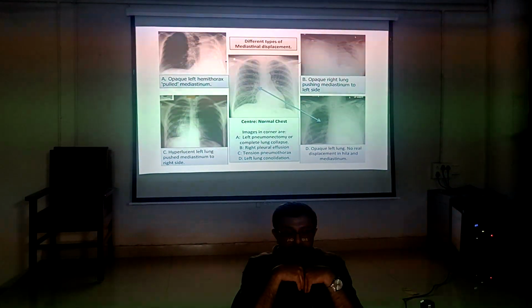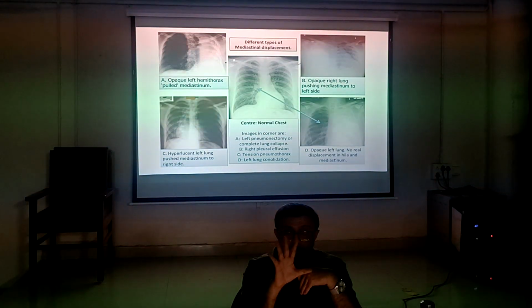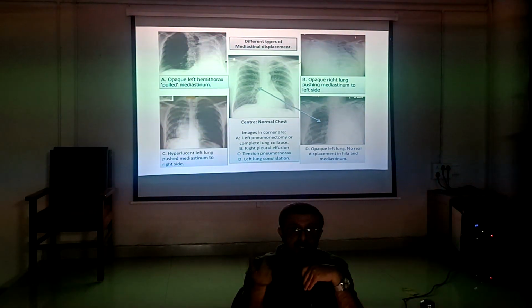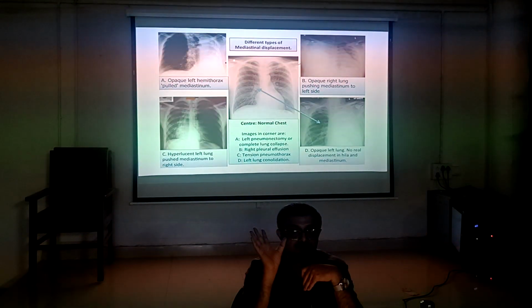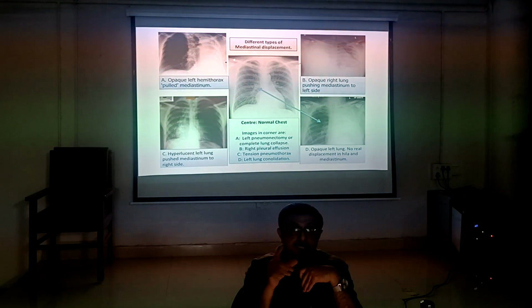Okay. B. Opaque right lung pushing the mediastinum to the left side. Hemi-opaque lung and mediastinum shifted to the opposite side. That means it is pressing and pushing. That means it is fluid. If it is opaque and pushing the mediastinum to the opposite side, it is fluid.